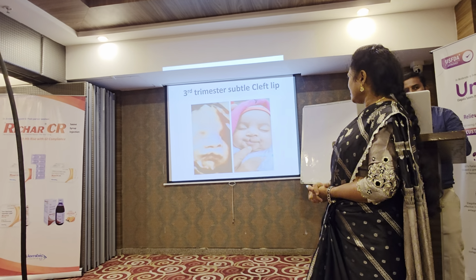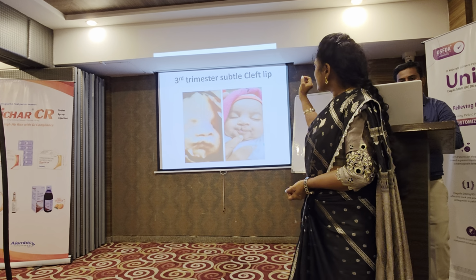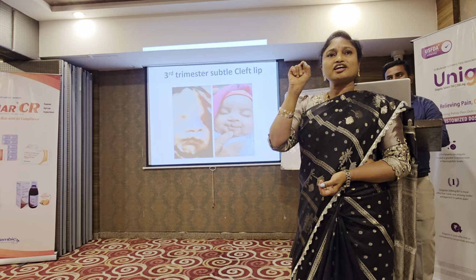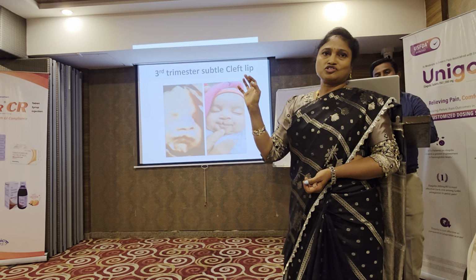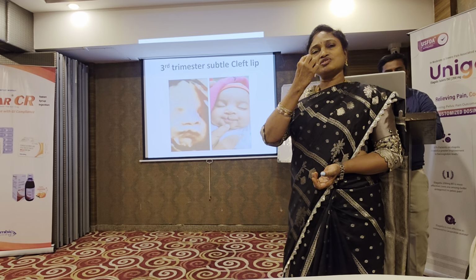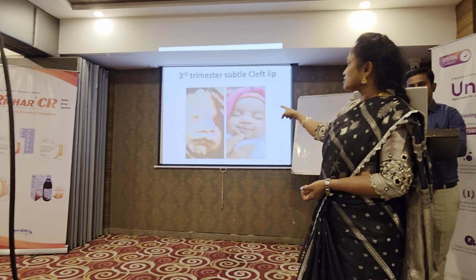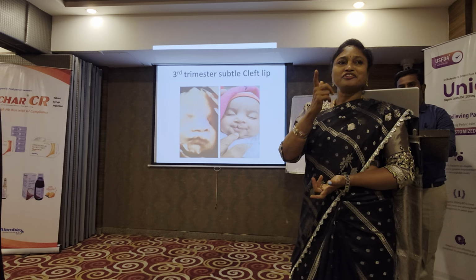So this was a recent one, a third trimester baby. We could make out this hair lip only in the third trimester, and that too only when I put a 3D box, only then I could see. It was not visible even up to almost the 7th, 8th month. I tried to go back and see, nothing was seen. Even the nose and the lips which we had taken were perfectly normal. This came only after the third trimester. It was a very subtle thing, but after delivery it looked quite obvious.